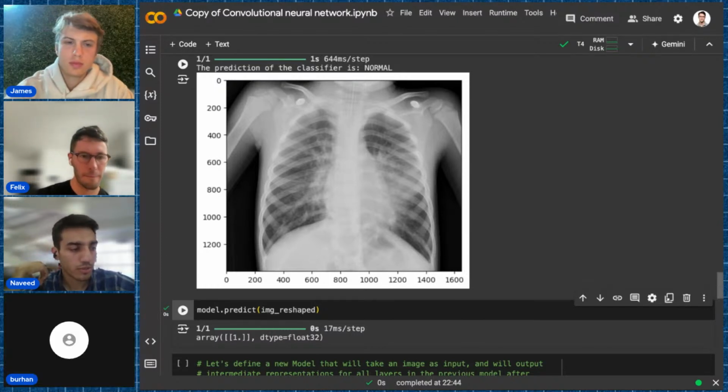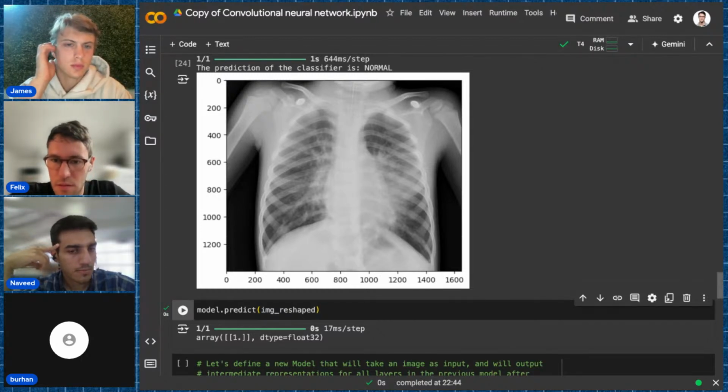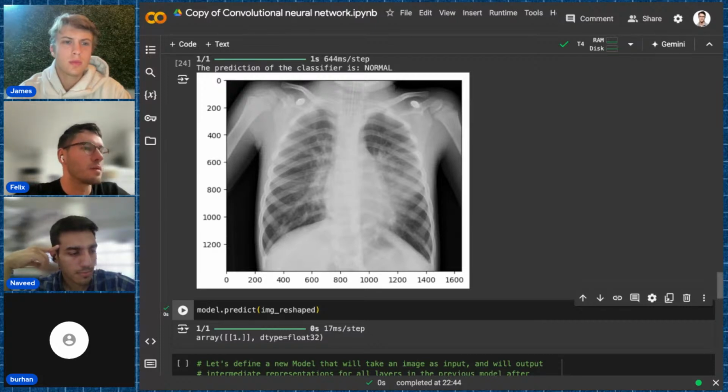Can you try this on a different example maybe? Yeah, sure. Let me see. Let's try this one. Give me a second.